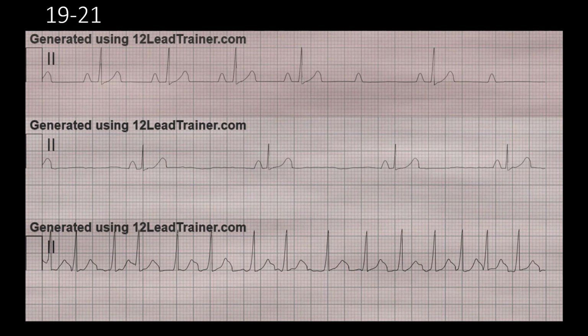Pause the video here. Alright, and now this one, it is irregular because you see the space from here to there and there is fine, but then we have this huge space right there. So this is irregular. Rate would be 1, 2, 3, 4, 5. So a rate of about 50 beats per minute.